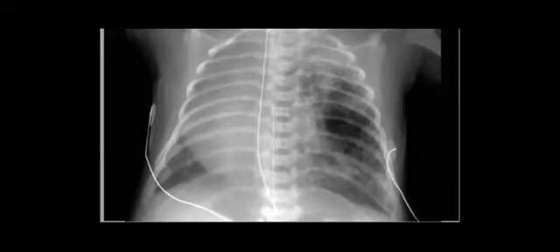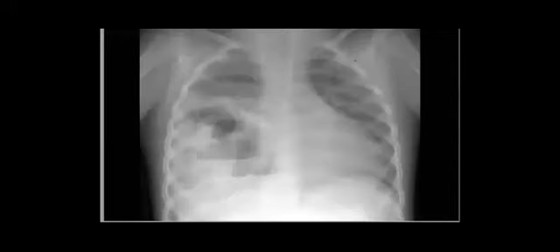Again, CPAM, and here it is a bit hard to differentiate from the diaphragmatic appearance. Maybe the diaphragm is not very clear, but this one I think is easier now to mention. Yeah, perfect, hernia. So this one will be the hernia one, what you like to see. Okay.